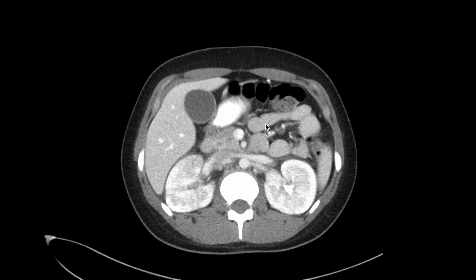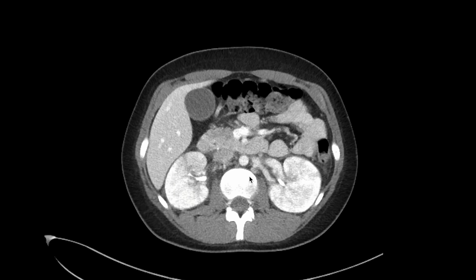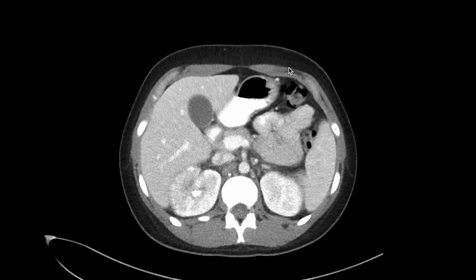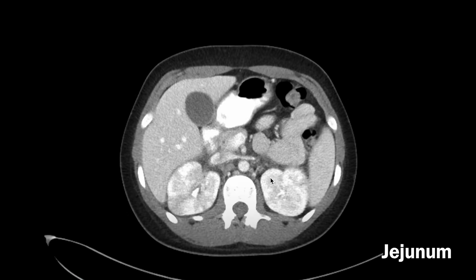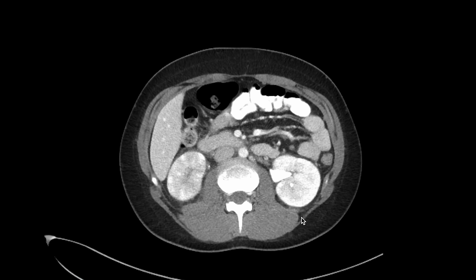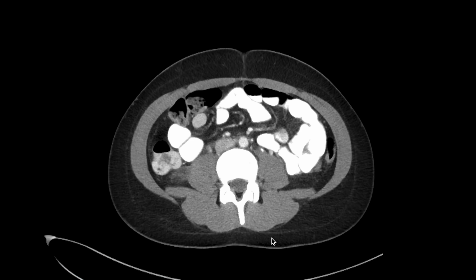And if I follow this out here, to the fourth portion of the duodenum. So the second and third portions of the duodenum are retroperitoneal, and the fourth enters back into the peritoneal cavity that we described earlier. We then connect to these jejunal loops that are often occupied in the left upper quadrant, but it's variable. And we don't usually follow the bowel in every case unless it's important, like if there's a bowel obstruction.